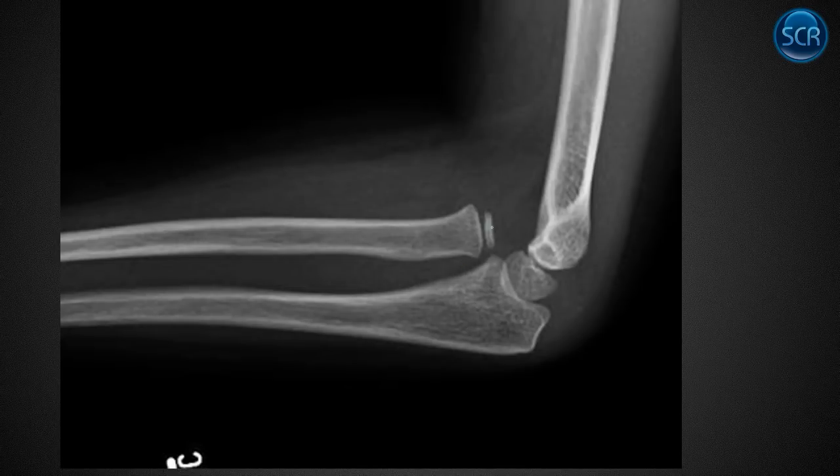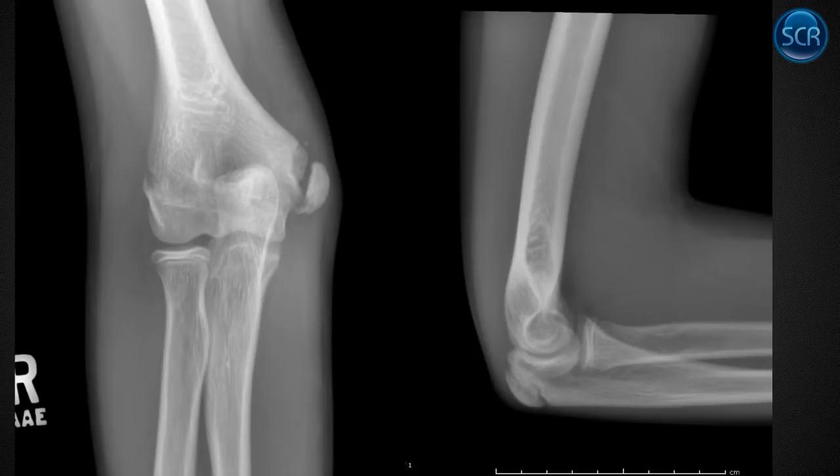Here's an example of a radial head dislocation, like I just mentioned, right? If you draw the line down the radial neck there, through the center of the radial head, this should intersect the central third of our capitellum here, and it completely misses. So this is an anterior radial head dislocation. Nursemaid's elbow, pulled elbow.